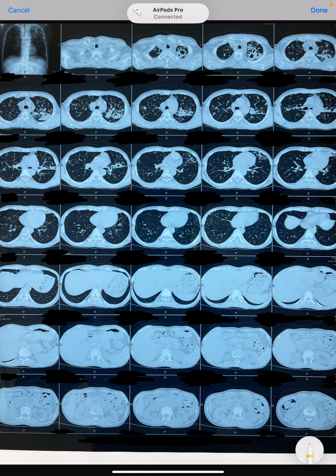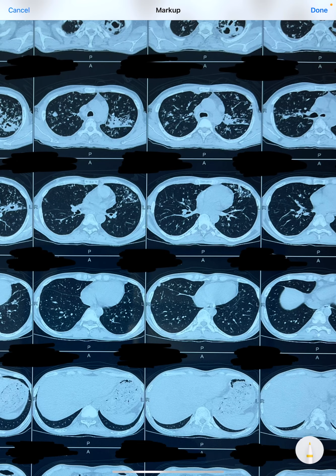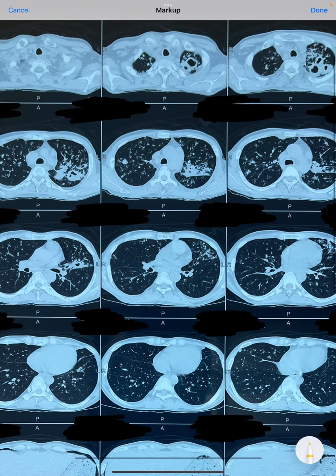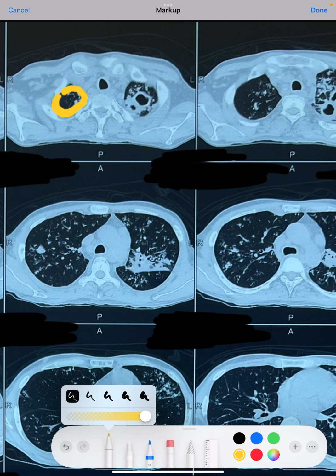This is a very interesting HRCT of the chest, high resolution CT scan of the chest. You can simply pause the video and try to figure out what the problem is. Now, when we see these lung parenchyma, the uppermost apices of the lungs, it is very clear that this is the lung, crystal clear. It is very apparent that there is no lesion on this side.